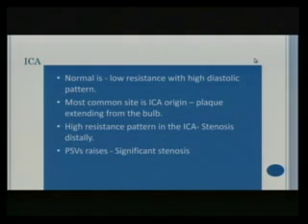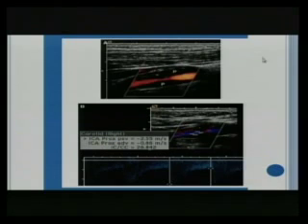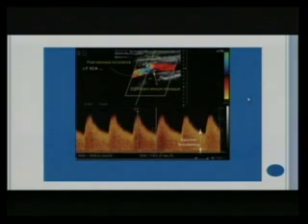And if the peak systolic velocity rises, then there is significant stenosis. And we'll come in a minute to what the criteria is. This is just giving you an example. This is a power Doppler image telling you that this could be a plaque, this could be a plaque, and there was 255 peak systolic velocity at the site of stenosis, just indicating that there is high-grade stenosis or focal stenosis at that point.